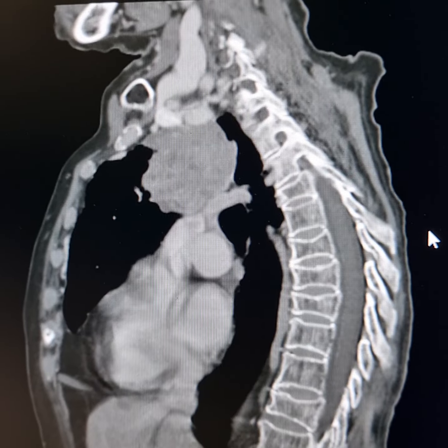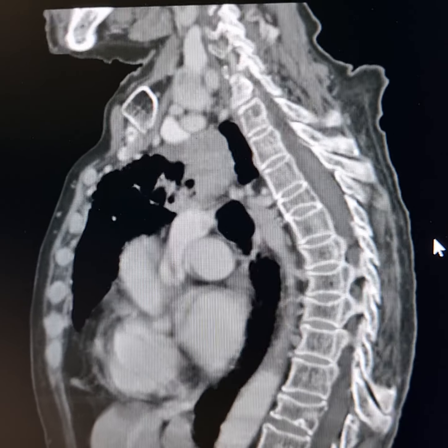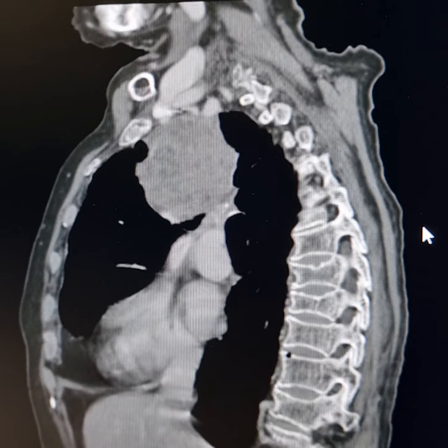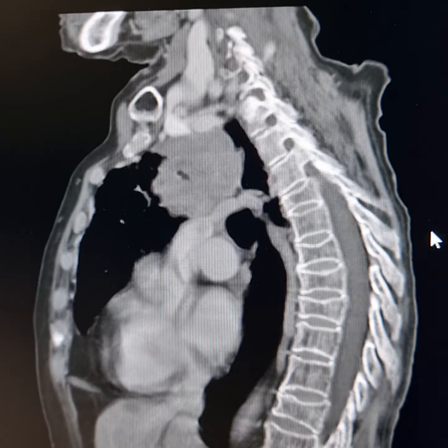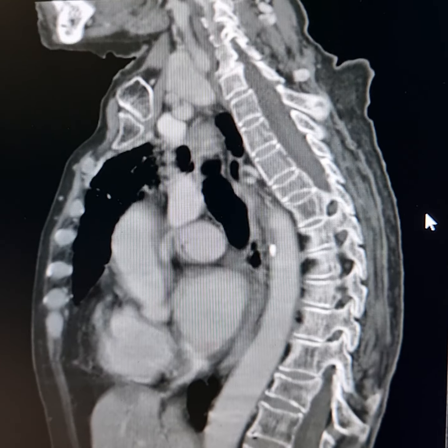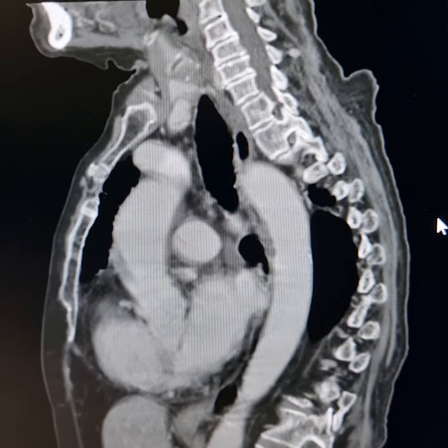Moderate osteoporosis is noted. There is moderate degenerative spondylosis. Partial compressions of the vertebral bodies are present because of the osteoporosis. Dorsal kyphotic curve is exaggerated.